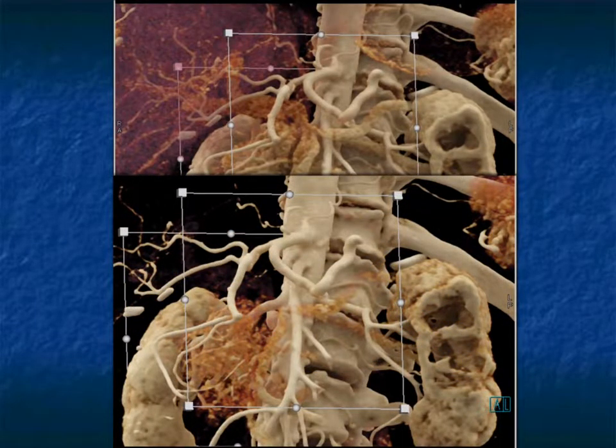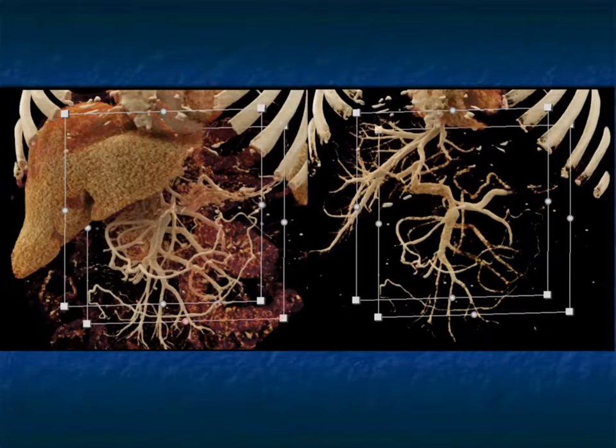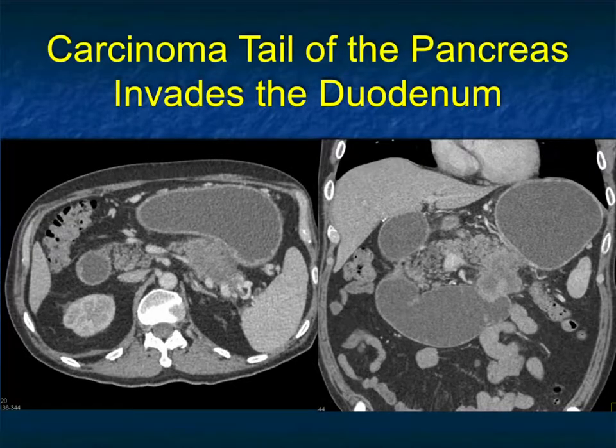As you can see, the celiac, hepatic, and splenic here very nicely, the GDA, as well as the SMA. So again, a comprehensive exam showing you arterial and venous structures is what we're able to provide. And you can see here this slight compression of the portal vein SMV confluence and splenic vein confluence. Again, all very important features when you're doing surgical planning.